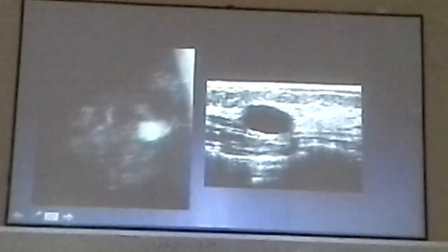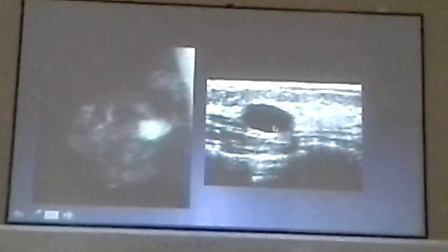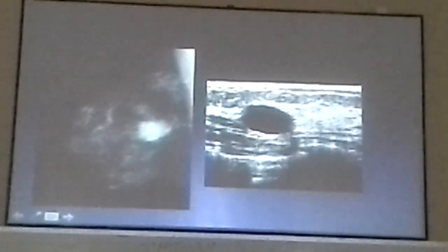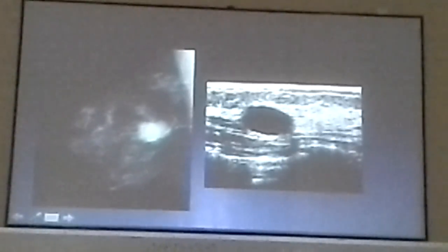Again, it can be benign or malignant. And if we do ultrasound and we see this kind of thing. Benign. So what is this benign what? Defined, because it's defined. This is cyst or fibroadenoma or what? Cyst. No, this is not fibroid. If you see on ultrasound black shadow and posterior acoustic enhancement, this is most likely cyst. Cyst and fibroadenoma will appear same on mammogram.